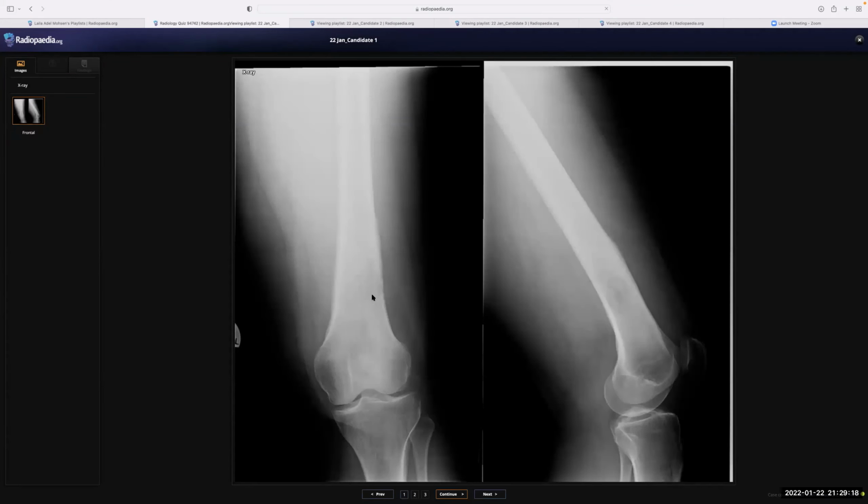first of all, you were right that it is not just a lytic lesion. There is a wide zone of transition here, as you noticed. But please be careful with the soft tissue lesions. So this is the lateral view. I expect fat lanes to be in here. So probably it's due to projection, or maybe the image is not so good yet.